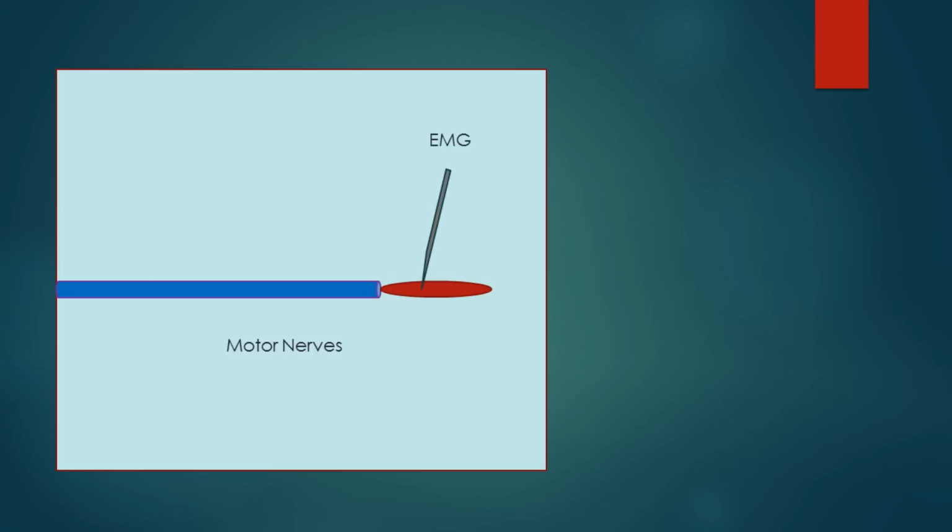This is where EMG comes in because we can distinguish between neurogenic and myopathic changes within the muscles. You can see further tutorials regarding neuropathic EMG and myopathic EMG changes by following the iCards above. For now, I just want to highlight that because motor nerves are larger and more myelinated than the sensory nerves, they are better at showing conduction slowing. And we'll talk more about this later on in this video.